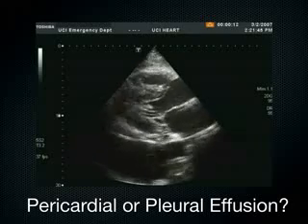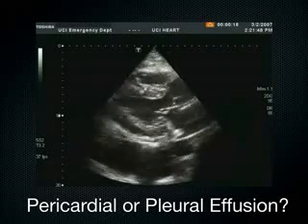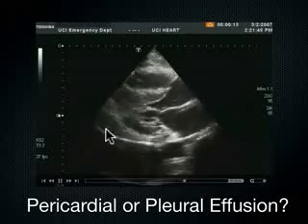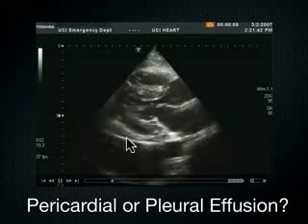Okay, last slide. Is this second to last slide? Is this pericardial or pleural effusion? This is the parasternal long axis of the heart, RV, LV, LA. Okay, the myocardium is back here. Is that also the pericardium? Is that white line the pericardium or not?